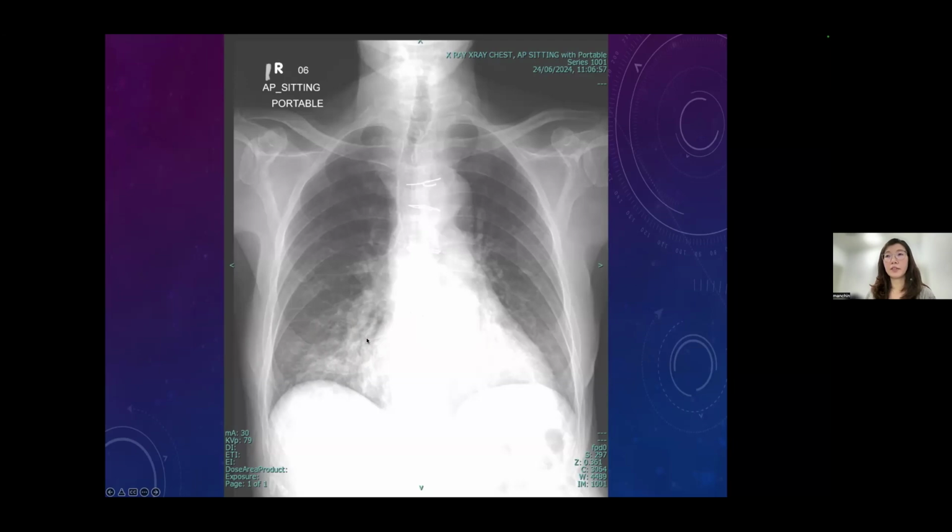Okay, I guess everyone can see. And actually, in this case, I want to show you the retrocardiac opacity consolidation. But sorry for this X-ray, I didn't adjust the contrast well to show it here. Okay, so remember the review area, the retrocardiac region. Okay, come, next case.